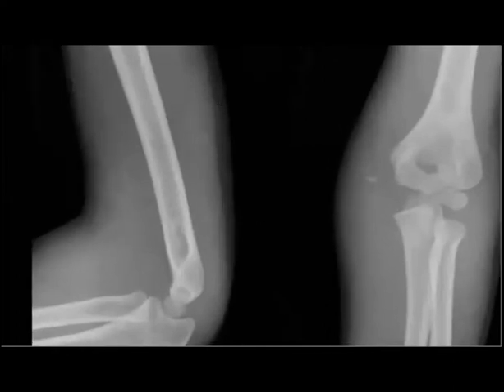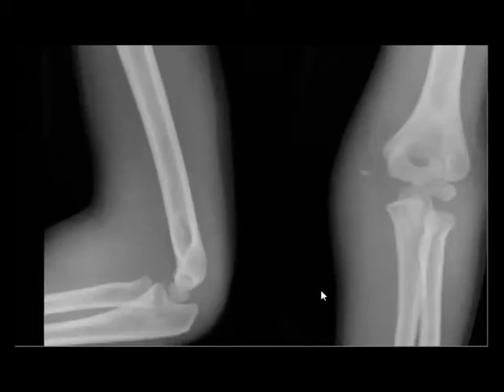You remember CRITOE, right? And you remember to check for the ossification sites of CRITOE. So capitulum and radial head, internal, external, trochlea, yes, CRITOE. Olecranon.